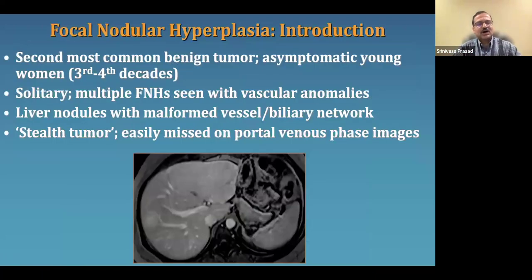Another common tumor that we typically encounter while imaging the non-cirrhotic liver is the focal nodular hyperplasia. Typically solitary, but one can have multiple focal nodular hyperplasias as well.